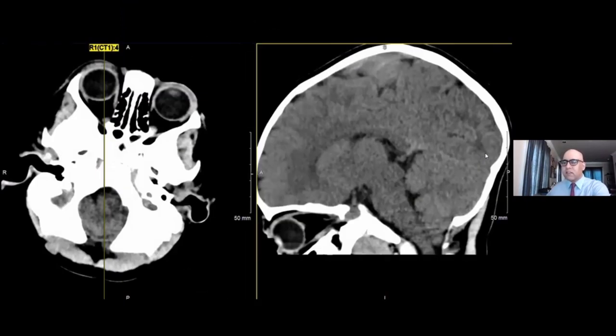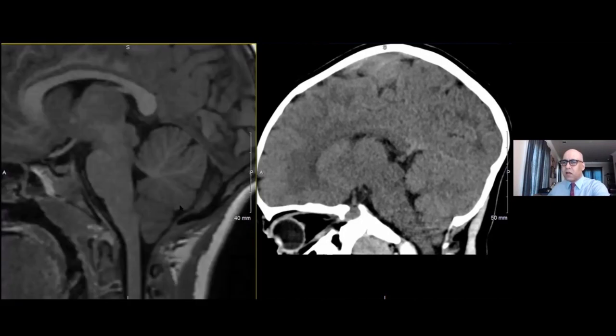With modern CT scans, we have the ability to have multiplanar reformats. And this sagittal reformat shows us cerebellar tonsils protrude caudal to the level of the foramen magnum. This can be approximated on CT, but the best characterization for this is on MR.